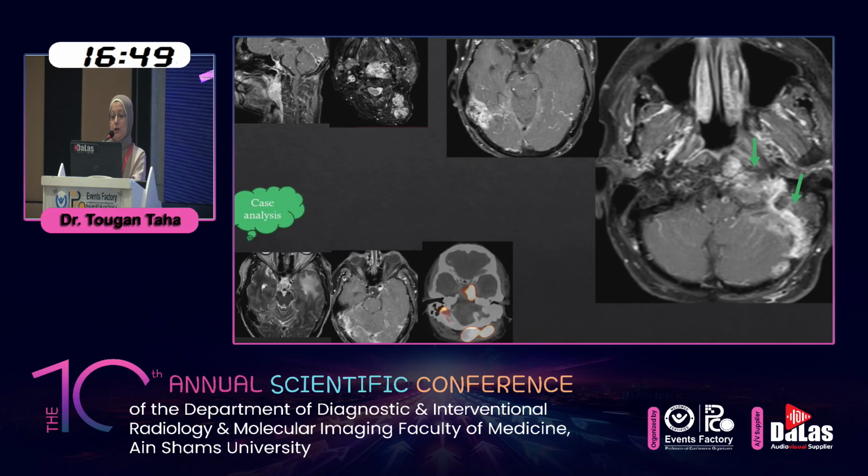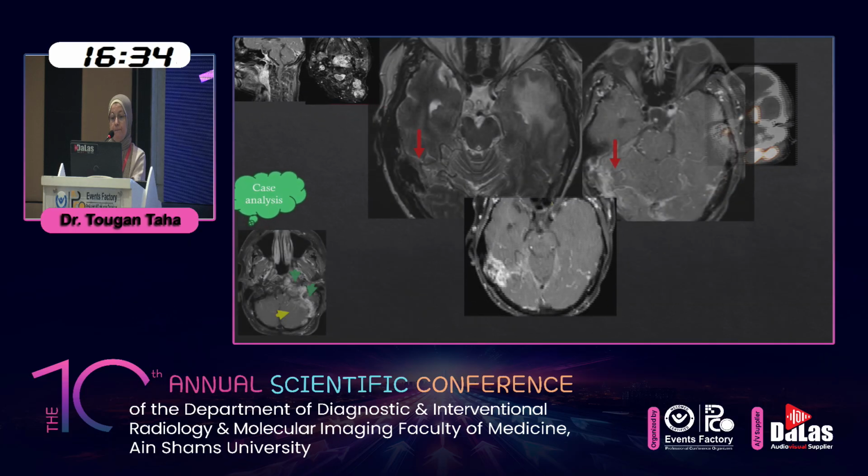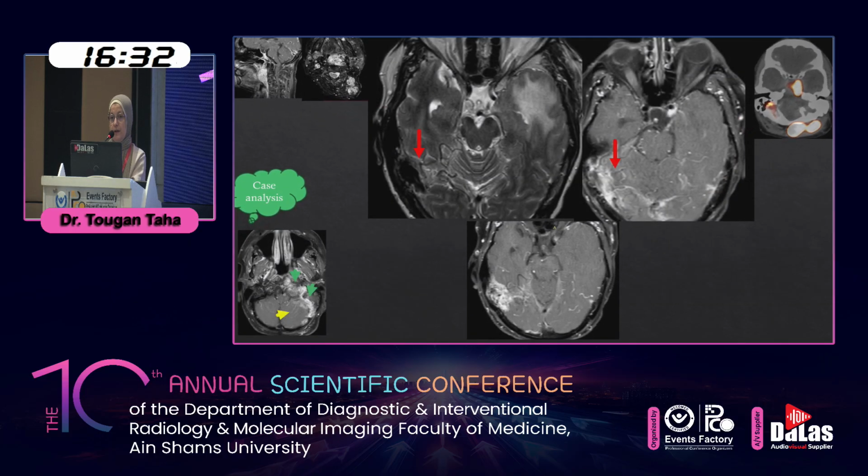Here is the left jugular paraganglioma extending to the sigmoid sinus, displaying the same enhancement. Adjacent to it, there is left cerebellar leptomeningeal enhancement. On the contralateral side, the transverse sinus is congested with multiple venous collaterals surrounded with edema, and there is bilateral posterior cerebral hemisphere leptomeningeal enhancement.